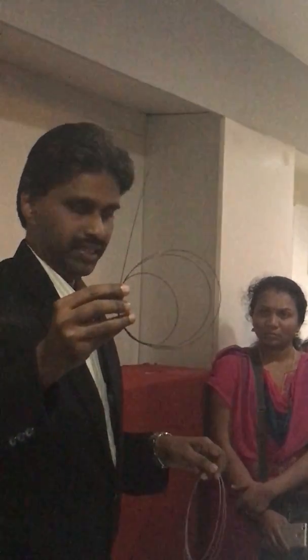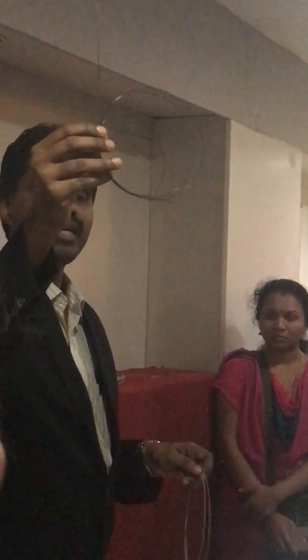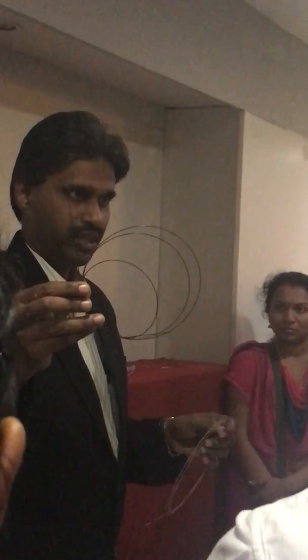Coming to the wires, what is this wire? This is called a guide wire. Okay, so guide wires are used within the angiographic catheters. Among these guide wires, this black one is called Terumo wire. And generally what is the size used? It is 035. 035 means 0.035.